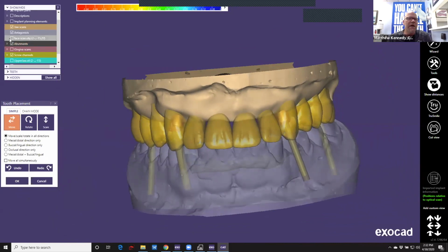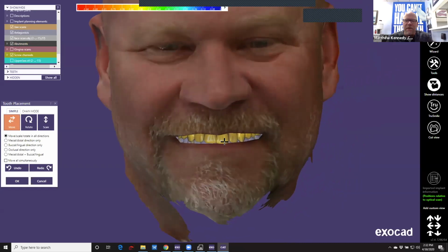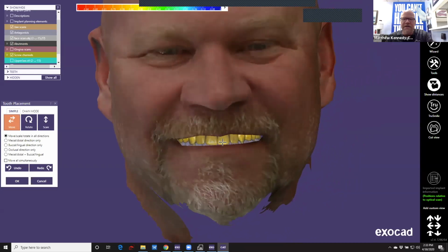Again, let's slap that big old head on there. Hey, there he is. Don't like it. There we go. All right. So you guys get the gist of it.